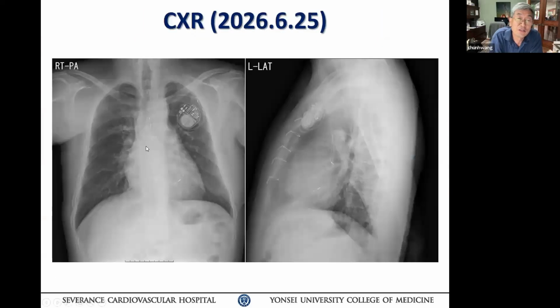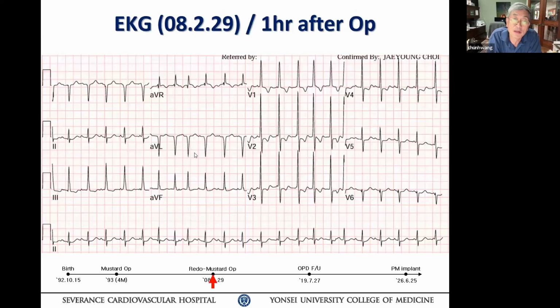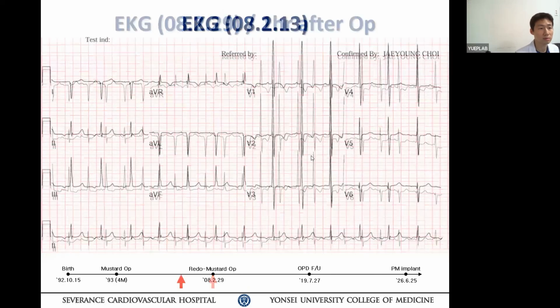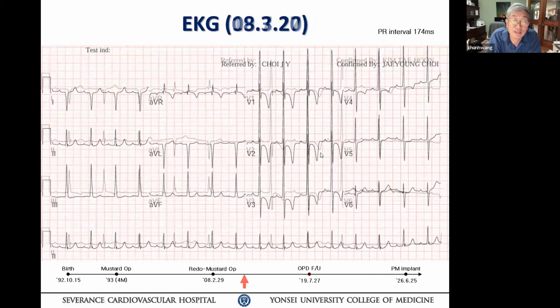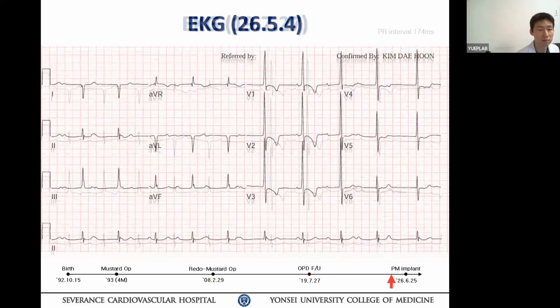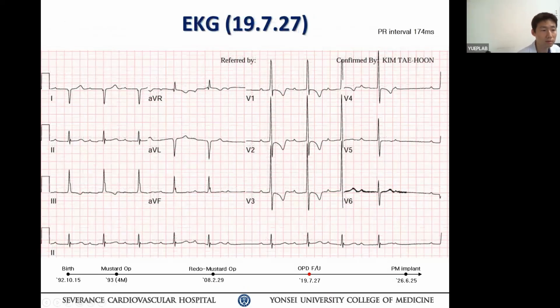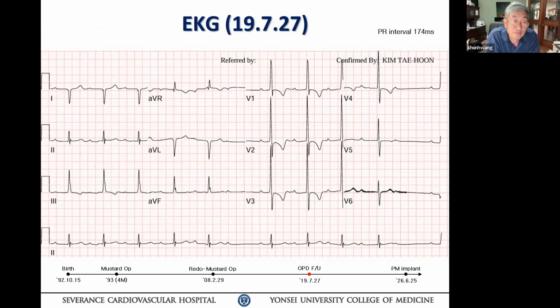Can you go back to that ECG that you showed before the surgery, before the heart block? You had a heart block ECG. No, just go back there. Yes, this one. Take a look. Look at this rhythm here. The PR got longer, and the PR was still exactly the same as what you see today, almost.